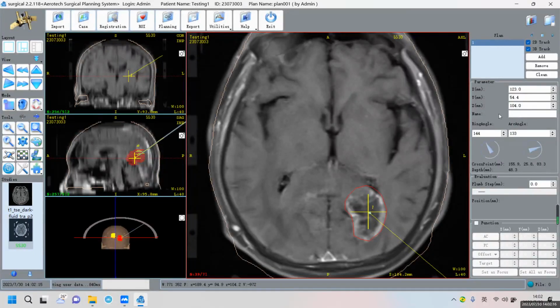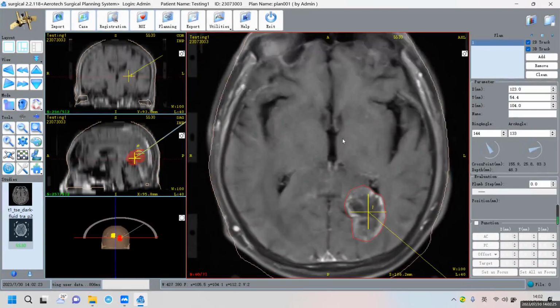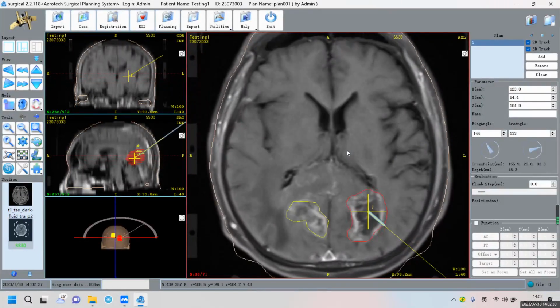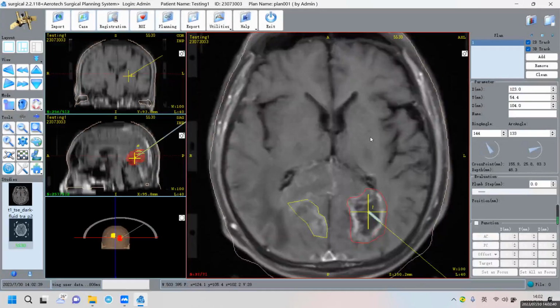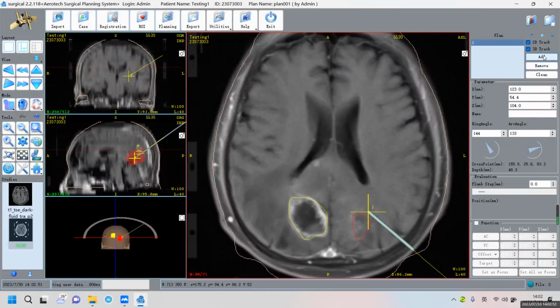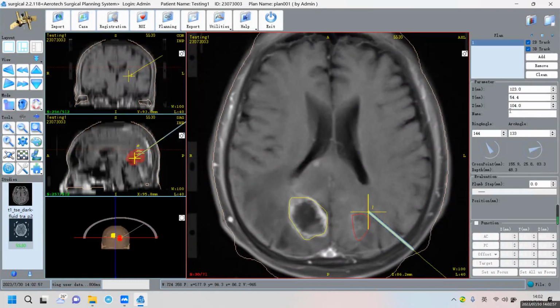For example, now for this focus, we have finished our target, and we can move our mouse wheel up and down to see each level. Is there any important area or something else? If there is no problem, we can set this value, record it, and proceed with your surgery. And as we have another focus, so we add. As I wanted to set up my point here.